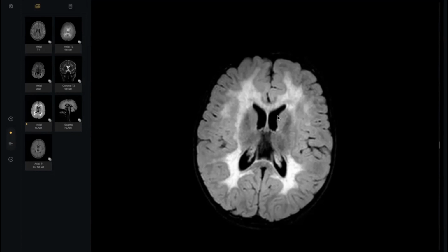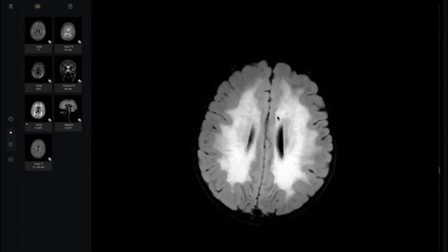Like here, see? I know, but it's not in my mind now. Okay, see, tigroid is bright, alternating bright and low signal. What is this low signal? What is the name of this structure? Venule, because the demyelination is perivenular here. Okay, this question is not expected in the exam, by the way, but I just activate our knowledge, all of us.